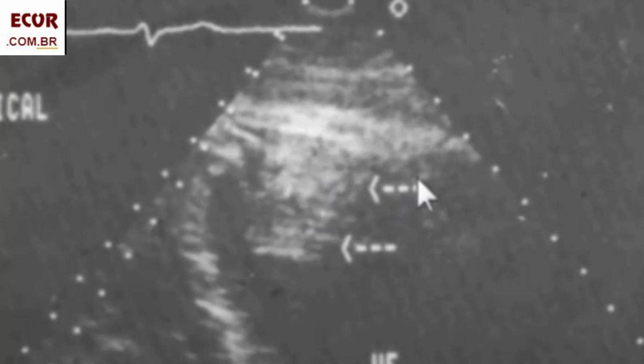If this wall were contracting normally, you'd know that the possibility of thrombus is minimal. Thrombus of ischemic origin only occurs in walls with abnormal contraction. If this apical wall is akinetic or dyskinetic, and there is something like this in the apex, frequently it may be mistaken as a thrombus. So how can we make the differential diagnosis?